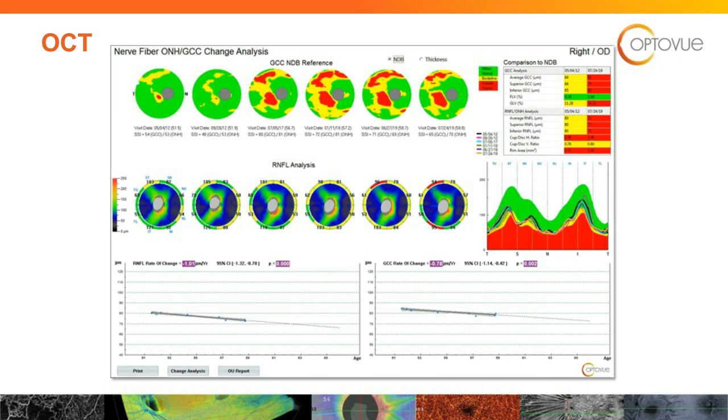Let's see if I can bring that up here. Good. All right, question number 2 is, on the TISNIT chart, the supratemporal asymmetry appears to be explained by just a small lateral shift, which may or may not be real. How often do you see that? That's a great point. I'm really glad that you raised that. So let's go back to that particular example.